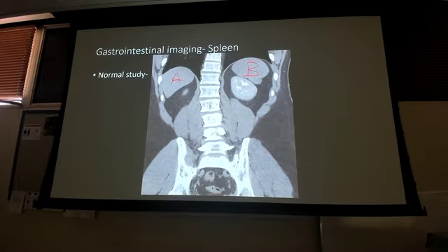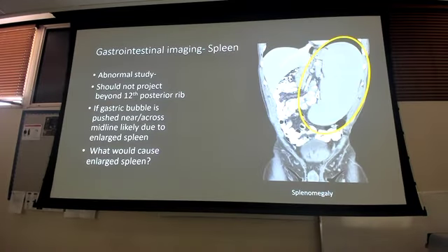Which one's the spleen? B. Spleen. Liver. You can't choose C. It's not there. Spleen and liver, right? They look the same. But boy, on this image, you can definitely tell me which one's liver, which one's a spleen if you know your anatomy. Okay. Cool. We covered it.